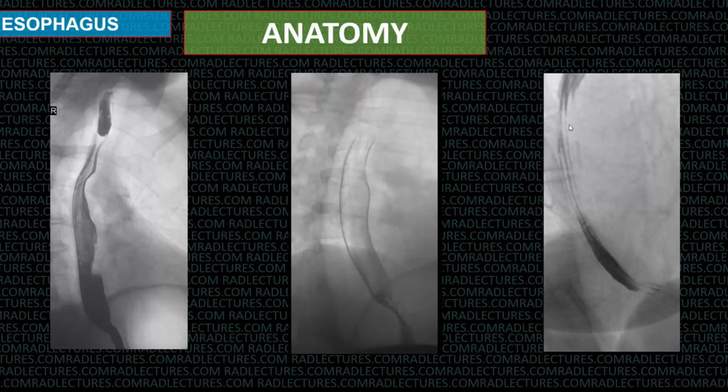Folds in the small bowel and large bowel are transverse. If you cannot get a good mucosal coating, this is a good view to look for the mucosa. These folds are always less than 4 in number. If they are more than 4, that means the stomach has come up. That is how we differentiate between the esophageal folds and the gastric rugae in a patient who has a hiatus hernia.